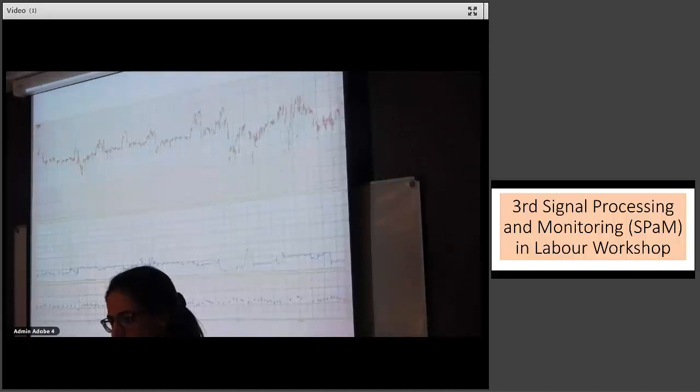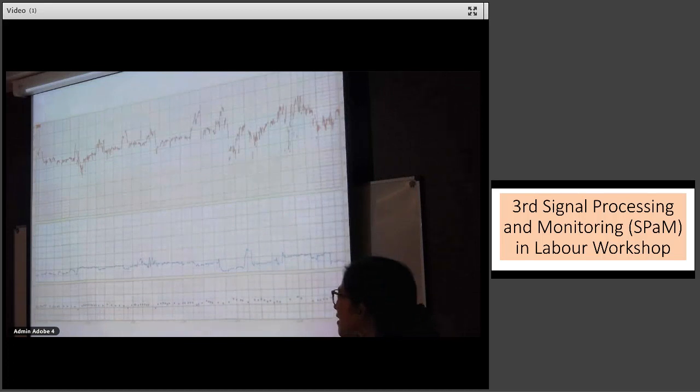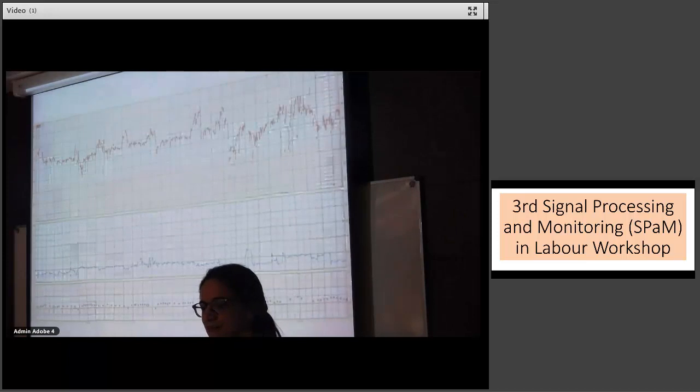Because a fetus that exhibits a trace looking like this is unlikely to be the same individual it was half an hour before. Labor is an escalating process. The fetus doesn't get better as labor escalates, if that makes sense. So for me, that would be an alarm bell. I'm not making any conclusions now, but that would be an alarm bell, particularly if mom is hot, if baby is already tachycardic, if you went from a normal trace to what we're looking at. I think I'll be asking more questions.